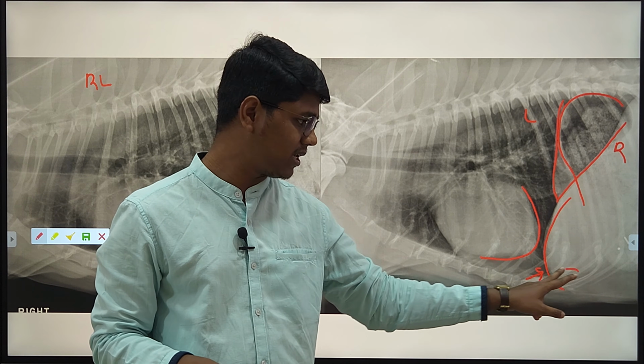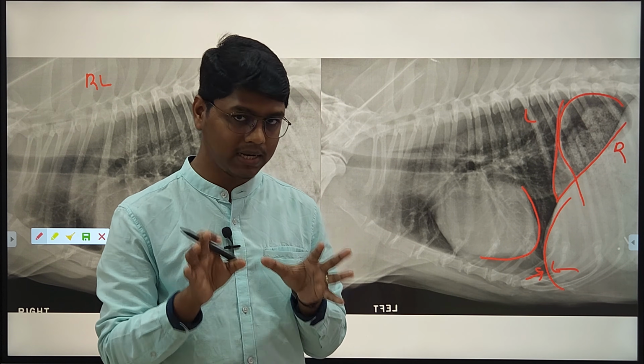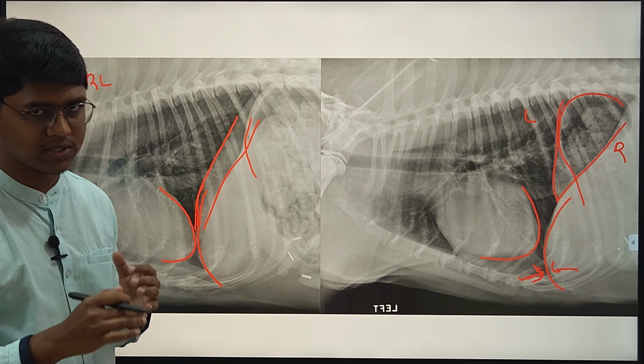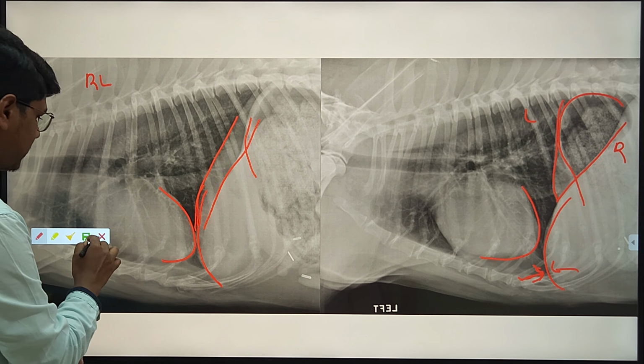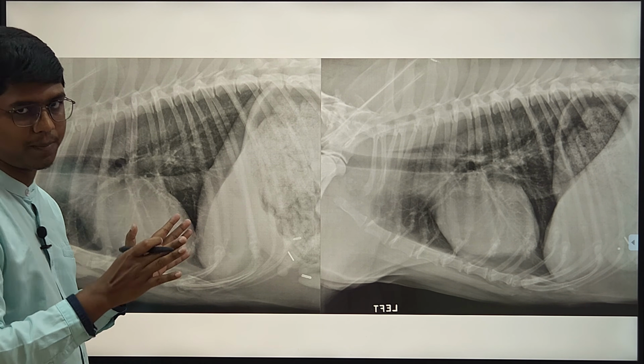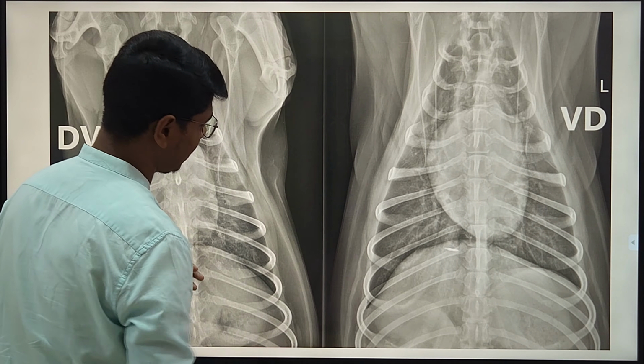Abdominal margin is not that clear because of soft tissue opacity caused by liver, while it is very clear in the thoracic portion because of presence of lungs. Okay, now we understood the diaphragm anatomy and how they normally appear. Okay, then you can appreciate the pathology.